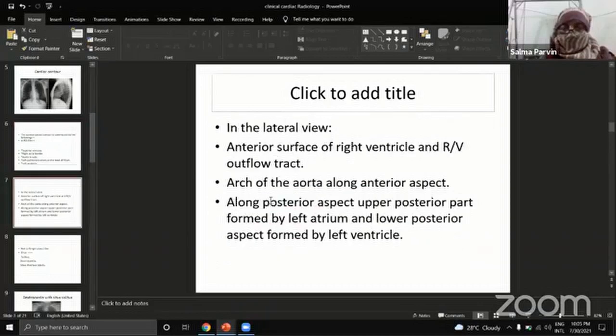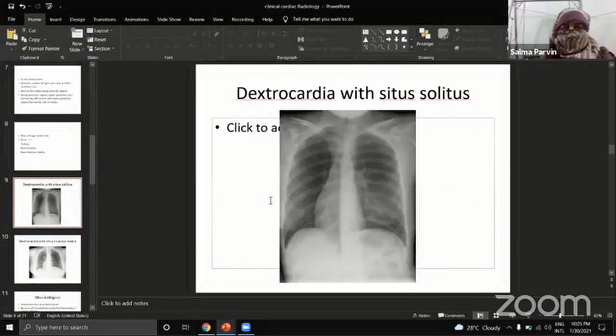And you can also agree with me that there are a few prominent vessels in the upper part, but even then the basal vessels are prominent and the upper zone is clearer.